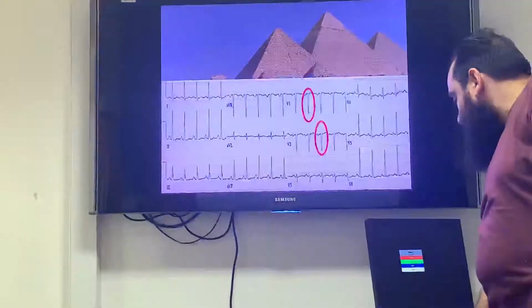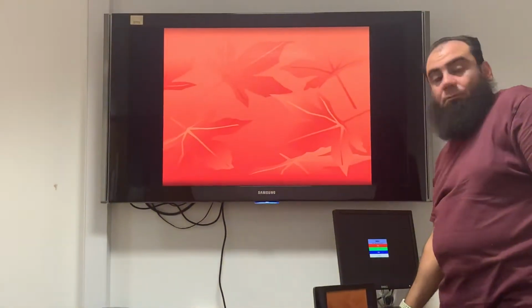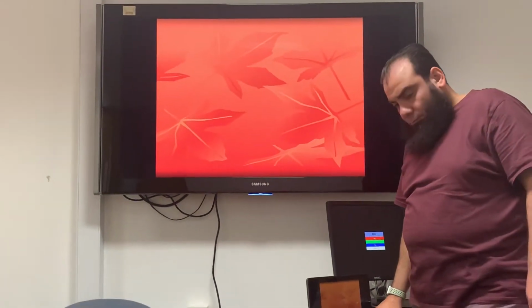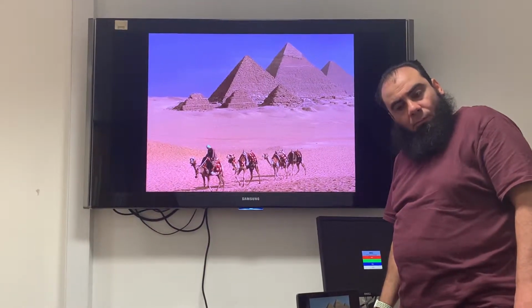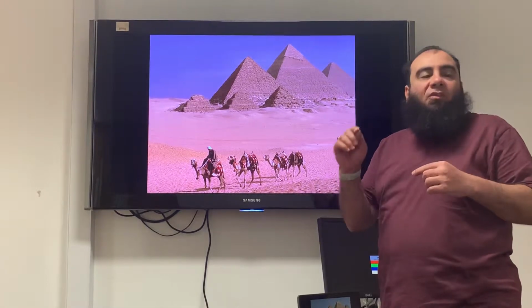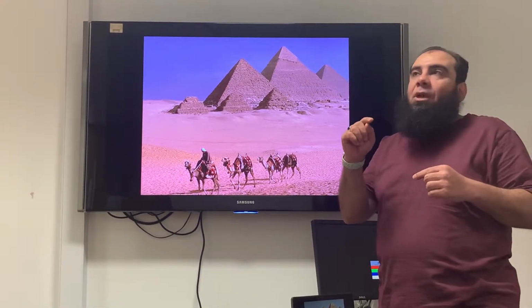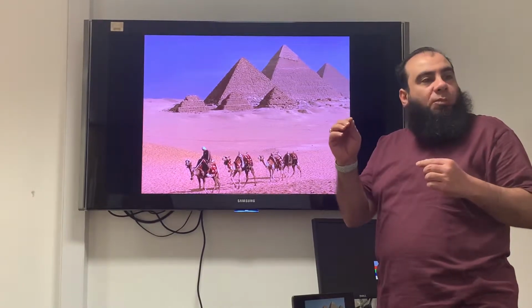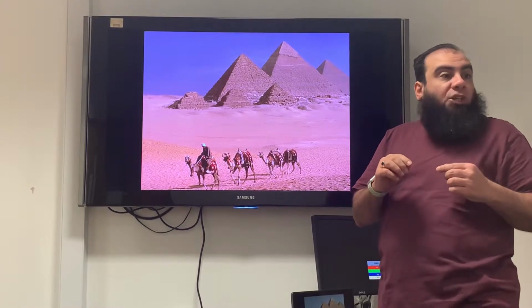Okay. What other conditions will have a Q wave? Apart from an old MI in 2, 3, aVF, what other conditions can we normally see a Q wave in 2, 3, aVF? We can see it in lead 3, as just mentioned earlier, as a normal variation. We can see a Q wave in 3 which can be as wide as 1 small square and as deep as 7 small squares, which can be considered normal.